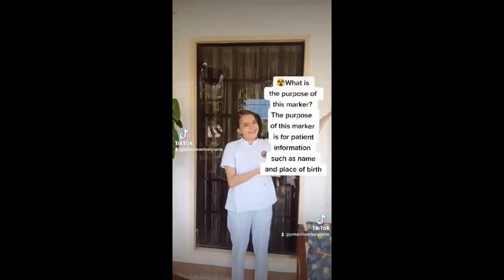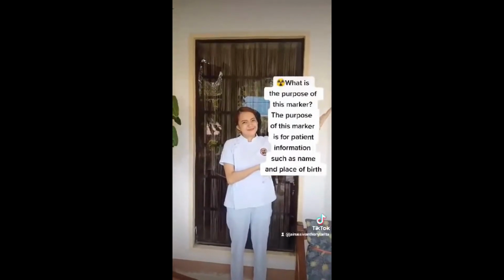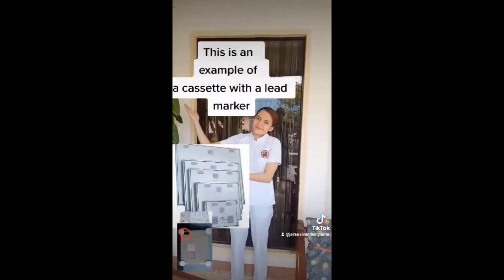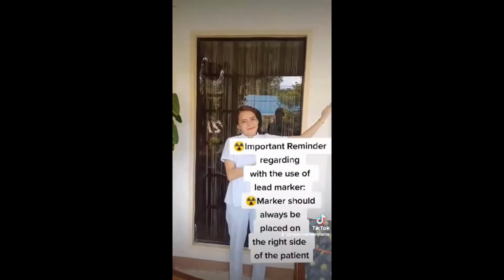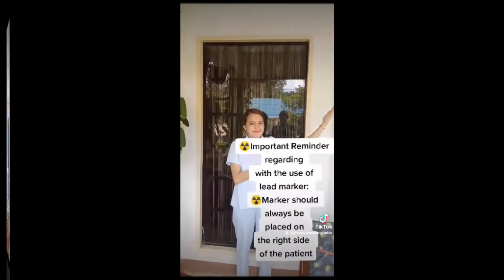What is the purpose of the marker? It is for patient information such as name and place of birth. This is an example of a cassette with a lead marker. An important thing to remember regarding the use of the lead marker: it should always be placed on the right side of the patient.